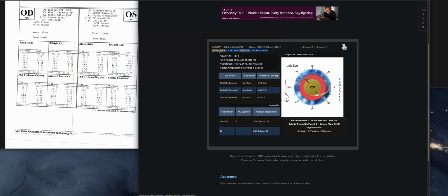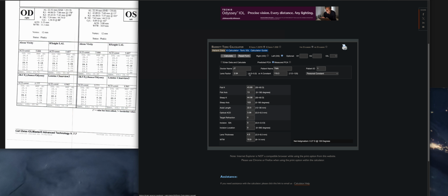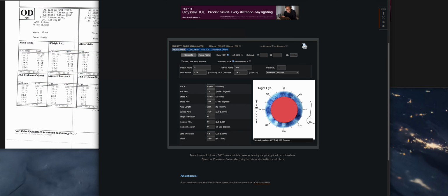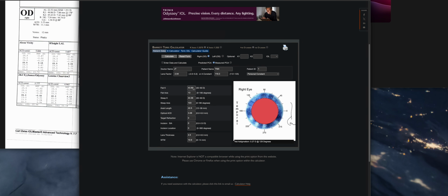And now we'll go back and do the right eye. This time I'm going to just help myself out here and calculate.